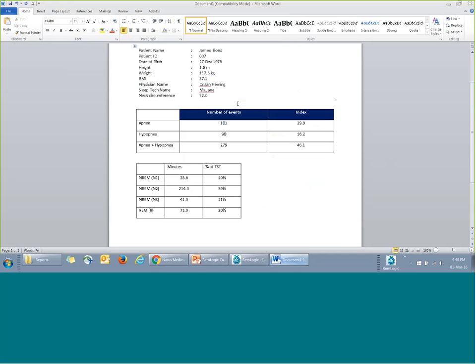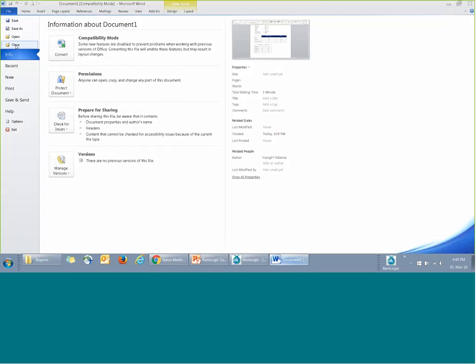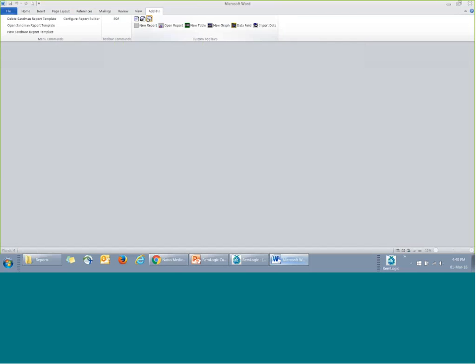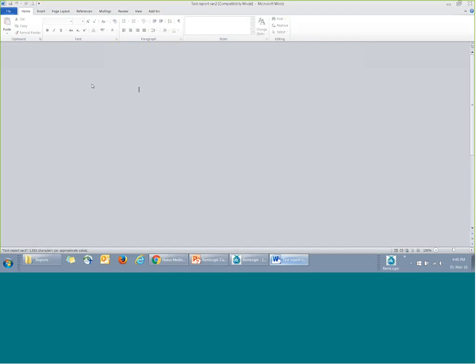There you go. Okay, any questions so far? The next thing that I want to show you is I will add a graph into the report. Okay, so first I will close this. Okay, I'll open my report again.